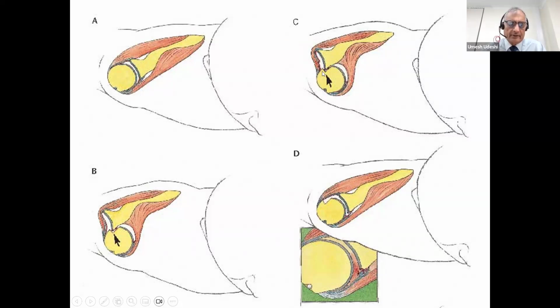So that one's showing us a Hill-Sachs defect. I think here there's a bit more color on the bony glenoid side, so there may be a bony Bankart as well. And then this one's after reduction. Then you can see a labral tear on this bit of the diagram here.